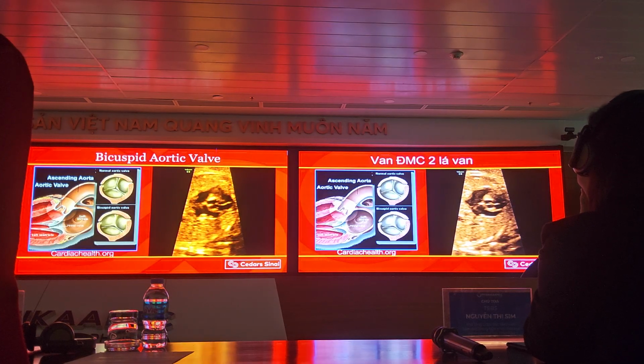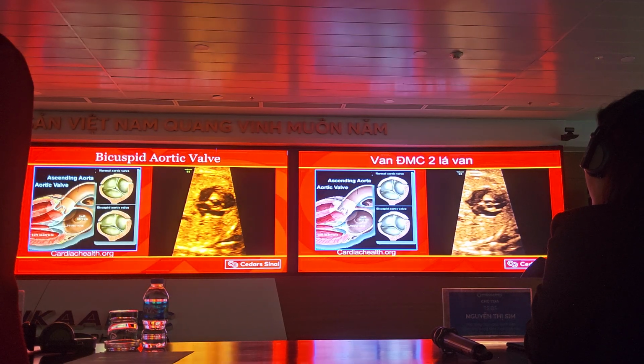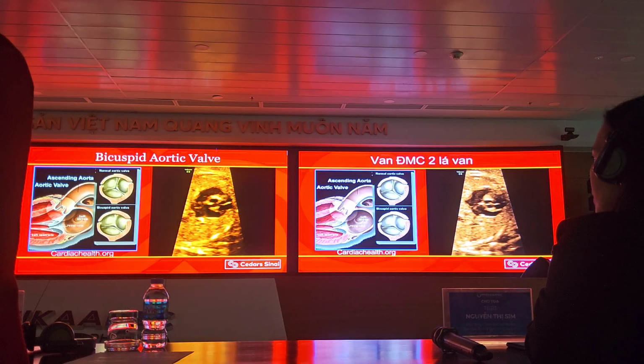It begins by being a bicuspid valve that then may progress to become aortic stenosis, or may stay as a bicuspid aortic valve with no stenosis and no regurgitation. It may stay that way for many years. But here on the left, you can see a normal tri-leaflet aortic valve, and what happens is two of the cusps fuse early on, so it's functionally two cusps, or bicuspid, instead of three. So here you can see it opening up like a fish mouth, right here.